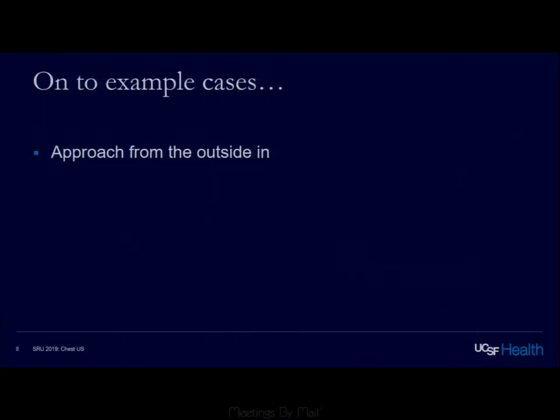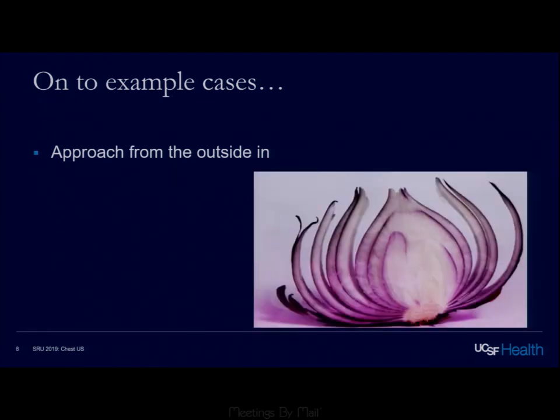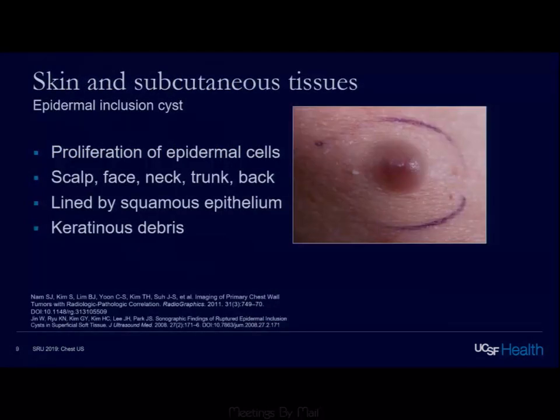So now we'll move on to some of the example cases. Again, we're going to approach this from the outside in, and we'll peel layer by layer. The first area I wanted to tackle was skin and subcutaneous tissues. I think we see this a lot. I'm going to talk about epidermal inclusion cysts.